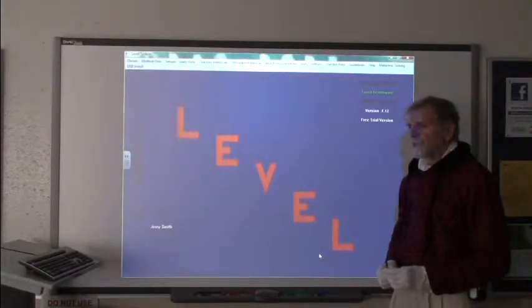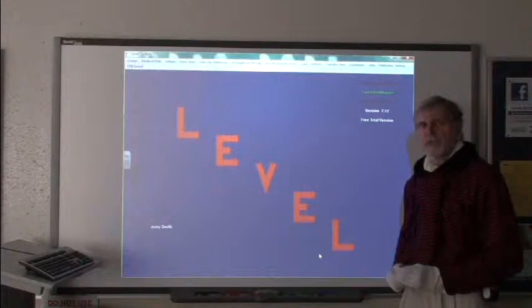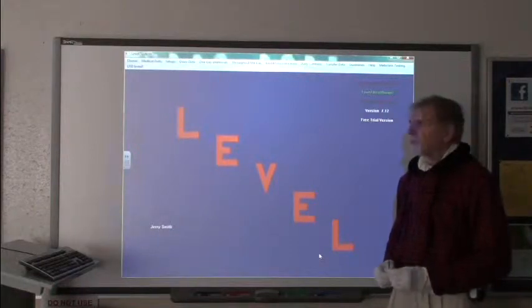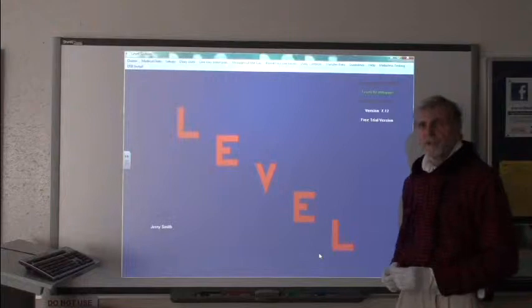www.prettyflowers1111.com. And this website has been set up by Level Healthware at Fat Cow solely for the purpose of users like yourself to put in your diabetes folder for the first few weeks of your use, so that you familiarize yourself with how to do it before you switch over to your own website.